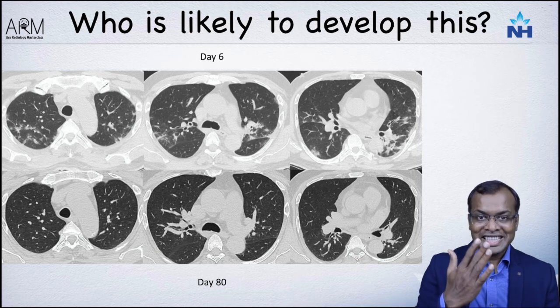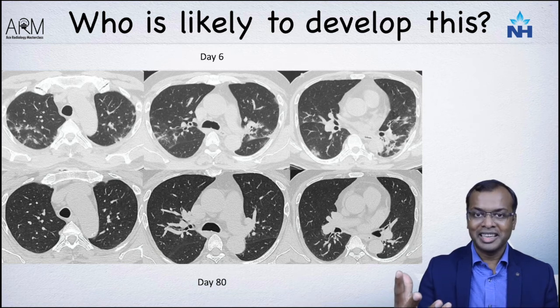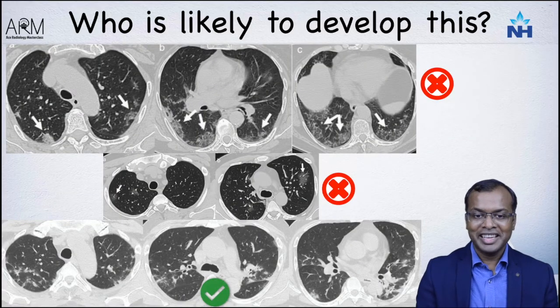So it is anecdotal evidence that mild disease resolves completely, but we are also seeing patients who have mild disease continue on to fibrosis but may remain asymptomatic. So you can see here moderate disease, one ends up in fibrosis, the other one does not end in fibrosis, mild disease still ends up in fibrosis.